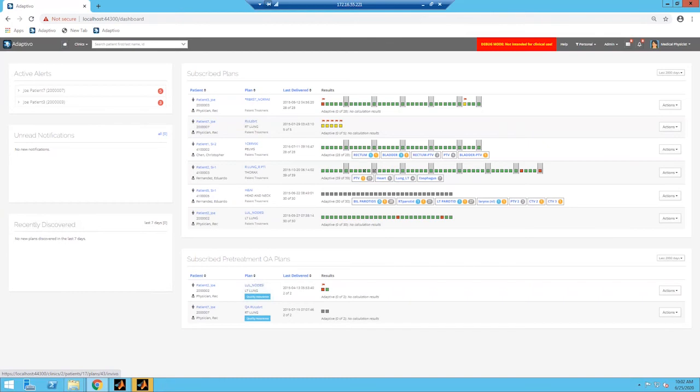When you review in vivo results, so again, we have three different components here. So we're looking at in vivo results, which are these green, yellow, and red chiclets, or little fraction boxes. The adaptive notifications are displayed by ROI, and then you have indications whether or not a deviation occurs. These are color-coded as well. So a blue is a rule that's been broken at the plan level. So a nice feature in the software is that you can configure plan rules. So if a treatment plan is imported into the software with an ROI that is outside of the tolerances configured in the software, it will notify you immediately.